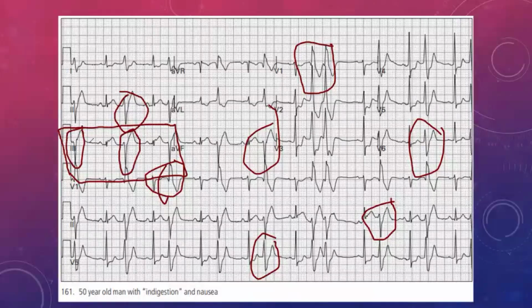And let's look at what we can see now. So now what we have left, once we've removed that, we're not worrying about these. We're going to come back to these in a little while. Right now, I just want to look at what I do know. So I've taken these out of the equation. What we see now is that I can see my little P wave there. Let me just change the color. I can see my QRS complex. And to some extent, I can see my T wave as well.